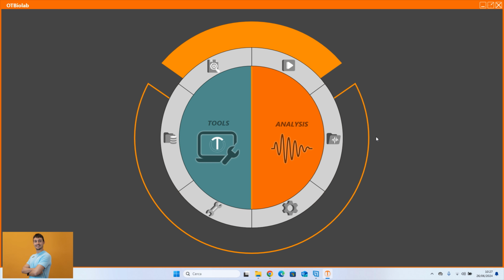My name is Fabio, I am a software developer at OTBIOELETTRONICA company, and today I would like to show you some new functionalities about Python and Matlab code integration. So today we'll see how to create some processing in the language you prefer between Matlab and Python and how to use it inside the software.